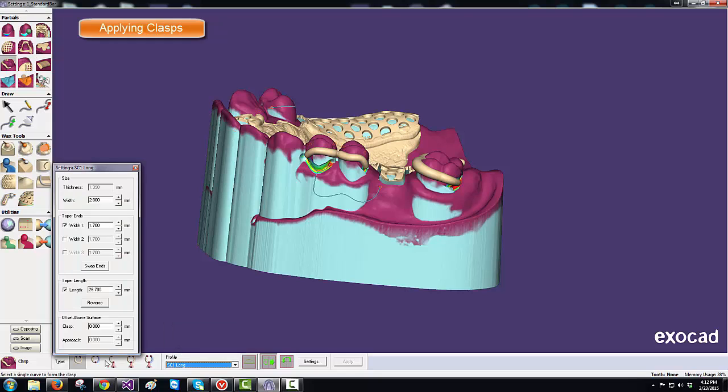Here you see a single curve in the type, the dual type, and the triple curve type. So for the roach, we've drawn 3 curves. We'll use the triple. Now those have to be clicked on in the same sequence as they were drawn. You'll get this preview. You can adjust your widths, drag your edit points, whatever you need.